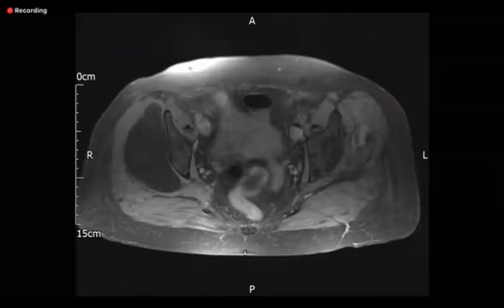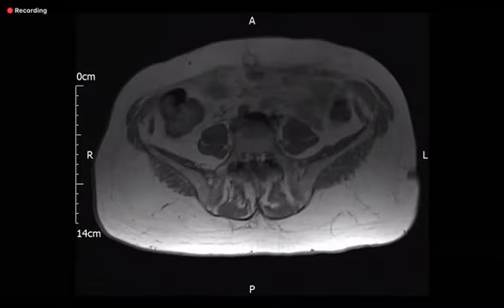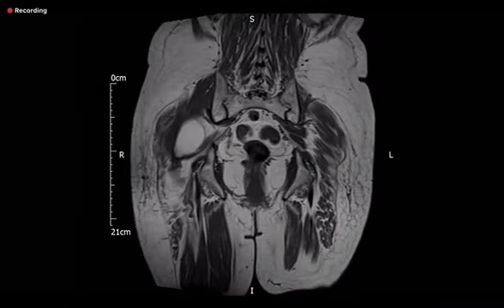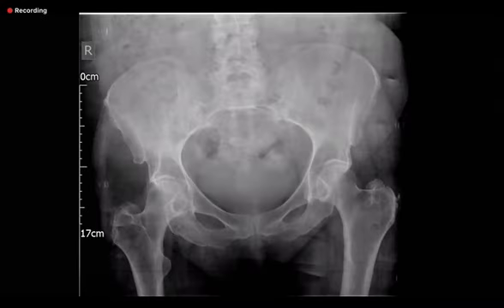Okay, I'll take over. Now, what we have learned from this case is that this was again the same category of case, a satisfaction of search type of case. If you see here, a pertrochanteric type of fracture, neck of femur, intertrochanteric type, you could have suggested on this plain film also.